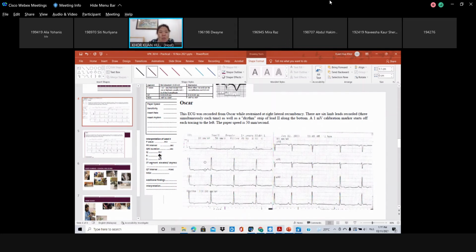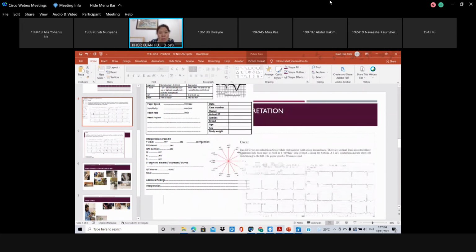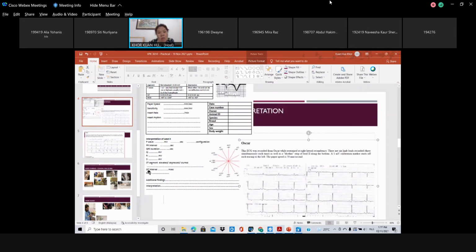Okay, the other reports, normally it's just going to be your ST segment. What do you think? I don't think it's slurred, maybe, but this one is okay. Subsequently, all okay. It was only slurred in one. So I will just say nothing. The QT interval is going to be like this, but normally I won't even ask you all about it. Let's do mean electrical axis.